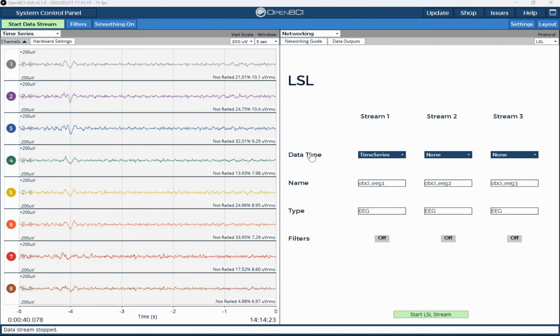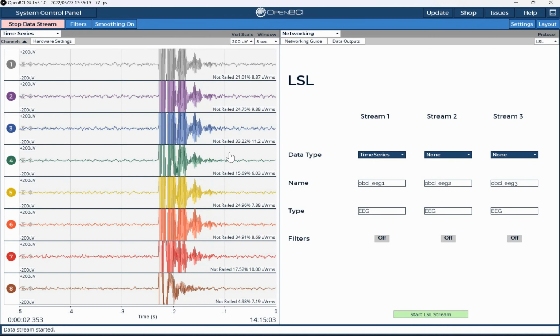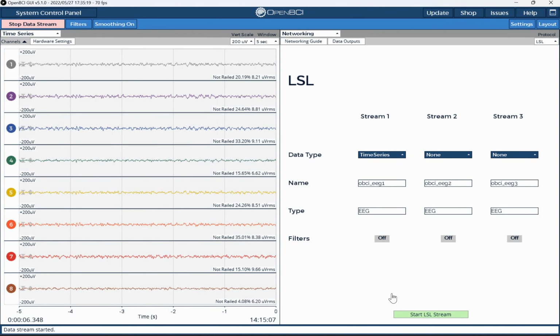This video presents how EEG data is captured and recorded using OpenBCI software, lab recorder, and Python scripts to capture data. The first thing we want to do to get started is launch our OpenBCI GUI and start the data stream. Once all the electrodes are in operational values, we can then boot up our LSL stream.